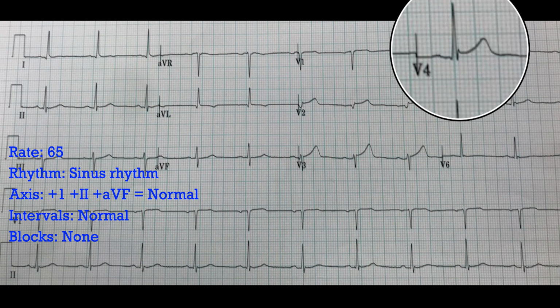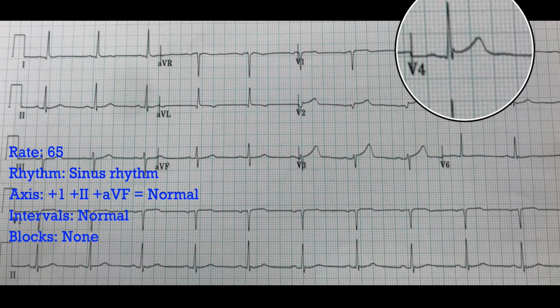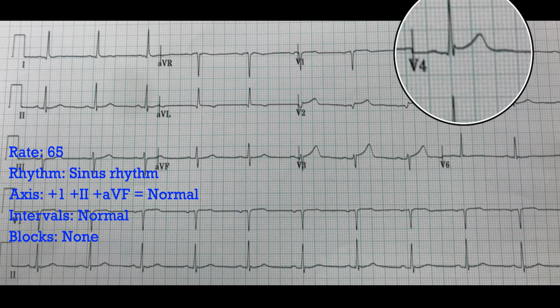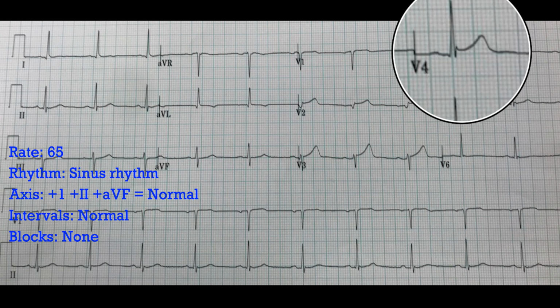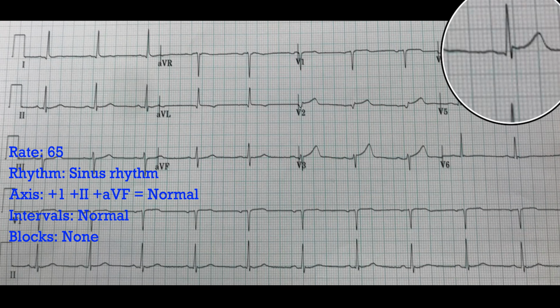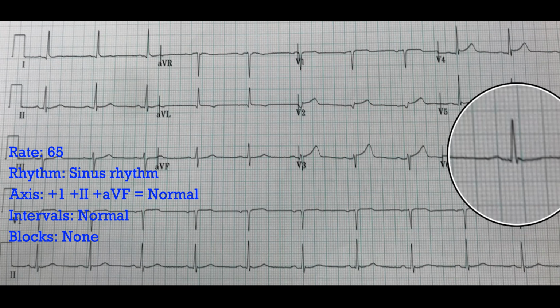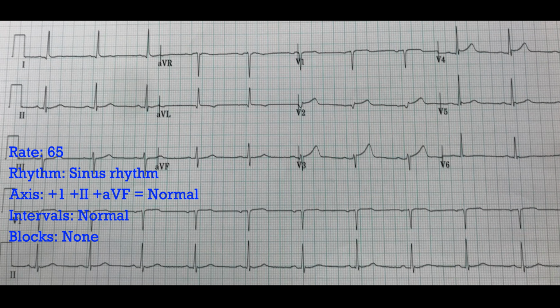And how about this guy? Here we see, you might be tempted to say this looks like a little bit of early repolarization, and certainly it could be, but I'll tell you that we'll say that this is not in a healthy young 24-year-old. To give you a little context, in the setting of a 65-year-old male with chest pain, there is a millimeter of ST elevation there. That little notch there might make you think that maybe it's not legit, but I will tell you that I'm still a little bothered by that one. And then it sort of peters out here. So we have some ST elevation that looks a little funny to us.